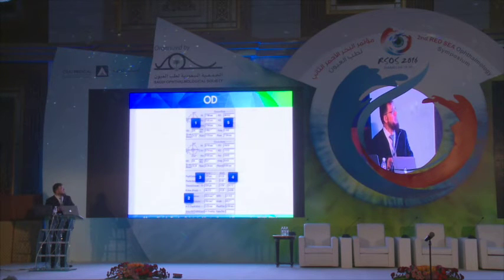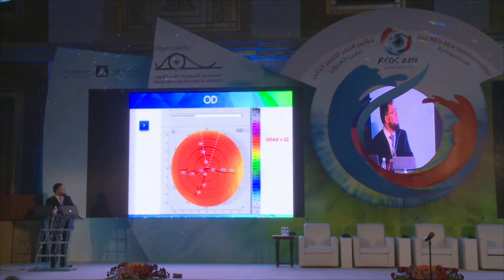The astigmatism, this is with the rule astigmatism. So the amount is okay, and I have to compare it with the manifest astigmatism of the patient. Q value is within the normal range, but this patient has skewed radial axis above 22 on the anterior curvature map.